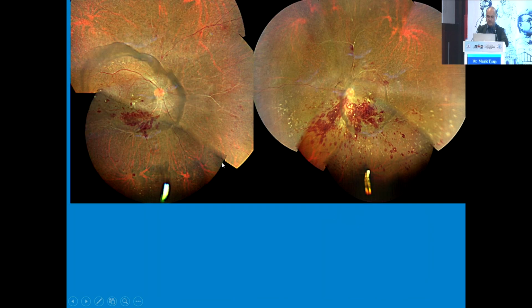So this is one more case which so classically highlights the importance of pattern recognition. So this was a patient seen elsewhere, thought of initially as intermediate uveitis, was given steroids, the patient did not respond. Subsequently started on immunosuppression, still the patient's vision kept on going down. Finally, after even IVMP was given, and then at the last resort, the treating physicians gave the patient Ozurdex, and you can see these two Ozurdex implants.